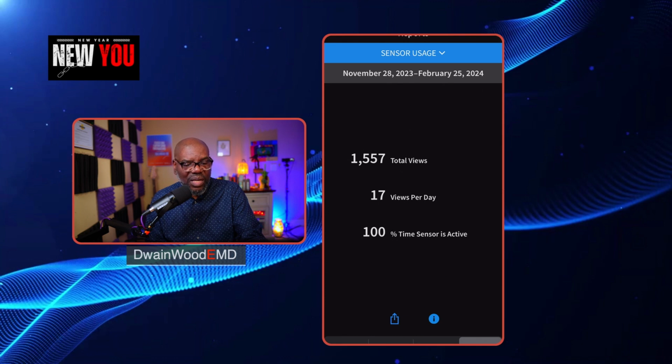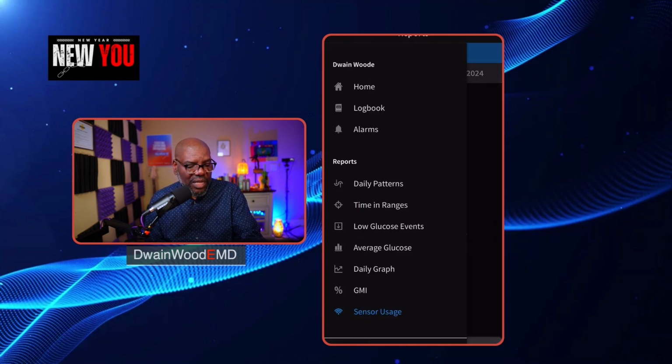And so you'll see there 1,557 views. That's how many times I've looked at this thing. 17 views per day. So I'm looking at this 17 times per day. And over the course of 90 days, 100% of the time, my sensor has been active. Now, the only time that it wouldn't be active is, of course, when I'm changing. Okay. And that really is pretty quick, at least the way I do it. As soon as that goes off, I typically change it. All right. So that's my daily pattern.